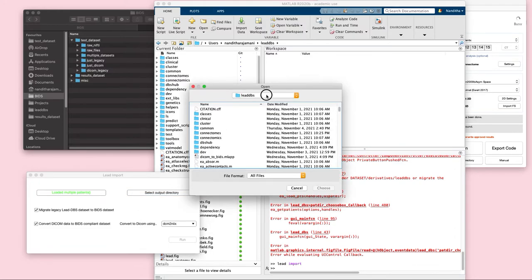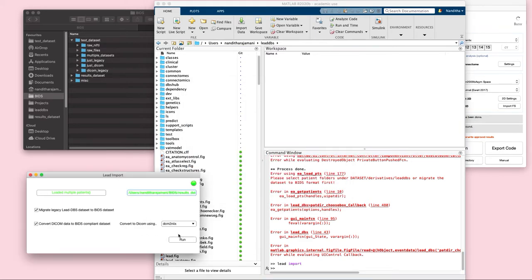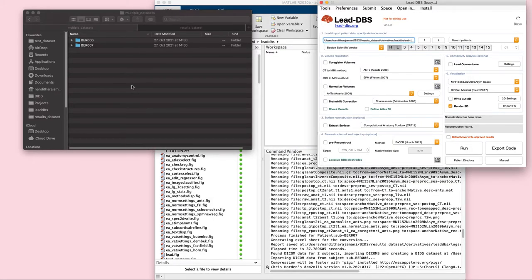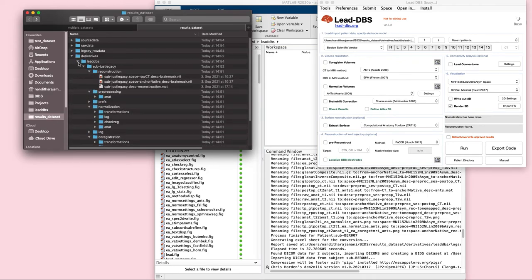And then you select the output folder, and this should allow you to run multiple data sets and convert them into a BIDSified format. So once the process has been finished, we now have our results dataset, which contains source data, raw data, legacy raw data, and derivatives for both the patients.